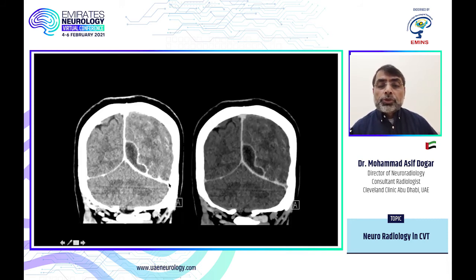If I look here, I don't see anything, but again, I have to change the window. If we change the window, now you can see there is a filling defect in the left transverse sinus, superior sagittal sinus, and the right transverse sinus is okay. So what is the lesson from this case? If you have a mastoiditis, make sure you look carefully at the transverse sinus, change your window, and document the patency of the transverse sinus.